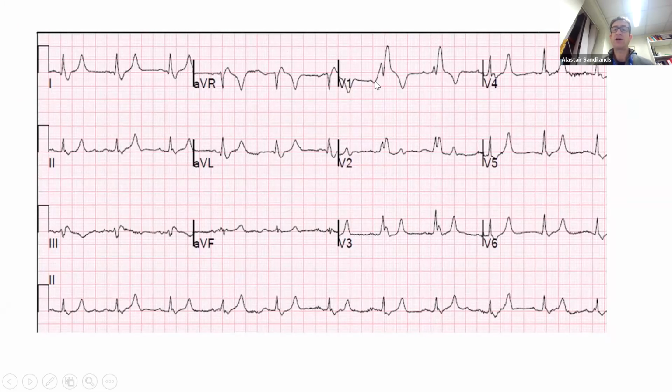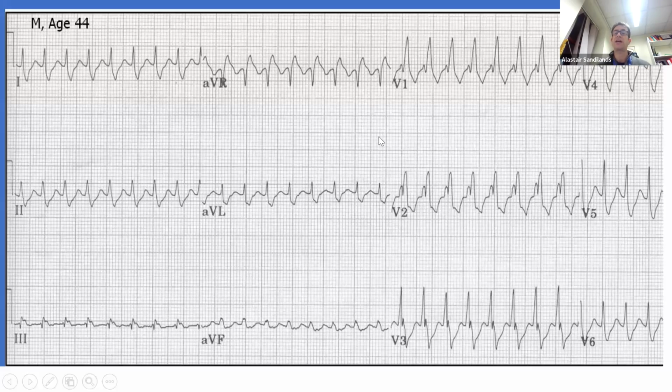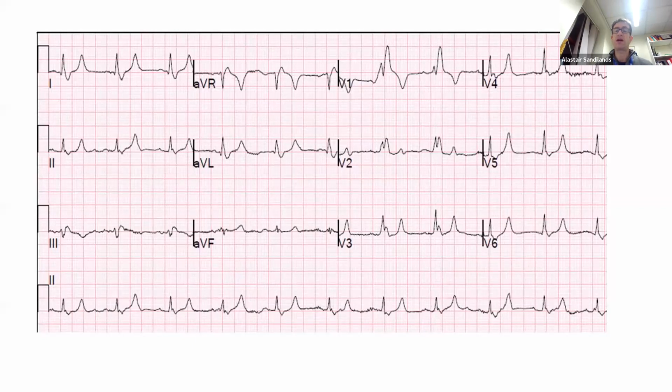In a similar way, we've got this ECG showing again a broad QRS with the bunny rabbit being small and large, a very wide QRS, slurring in AVL, and the S wave in V6. So we know this is right bundle branch block. Let's see what happens when this patient goes into tachycardia. We have the small bunny rabbits here, the big bunny rabbits here. It's a broad QRS. It's regular. In this V1, the small then the big is likely to be right bundle branch block, and it matches the right bundle branch block V1 in the sinus ECG.